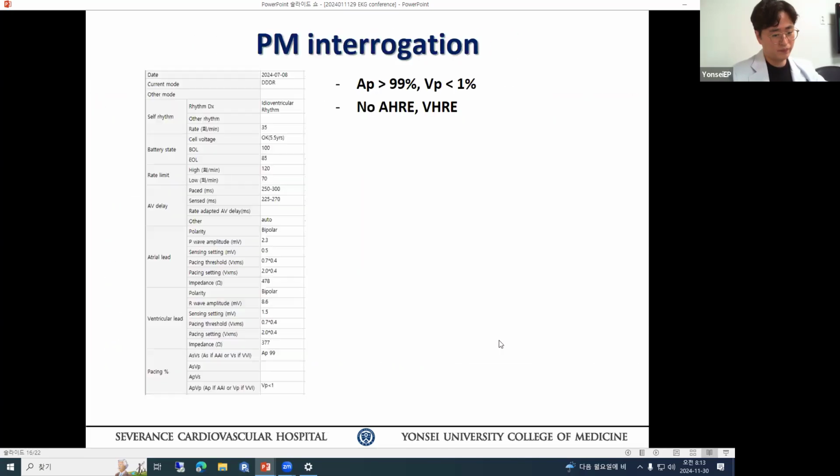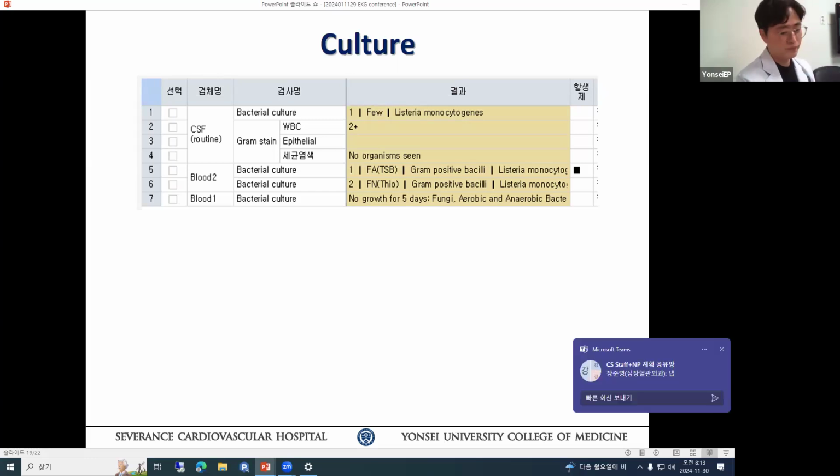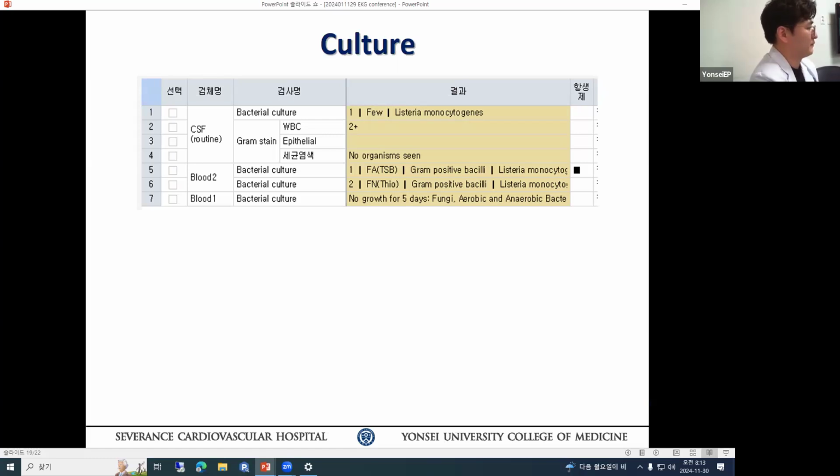150. Alright. Because these days the dual chamber pacemaker capture is so narrow, and also sometimes very difficult to see the pacing spike. Okay. So sometimes you always check the pacemaker upper rate and then the tachycardia rate. Sometimes that's what we use. Okay. It's pacing technology, and implanted devices are improving so much.